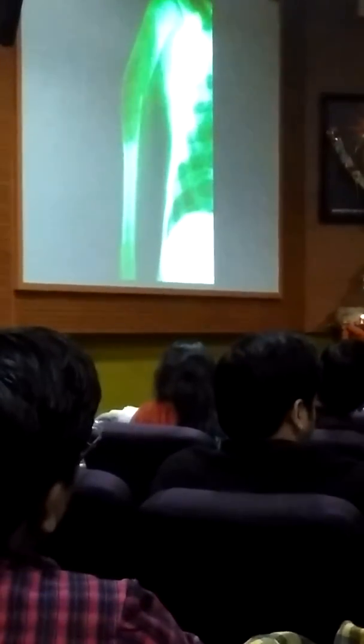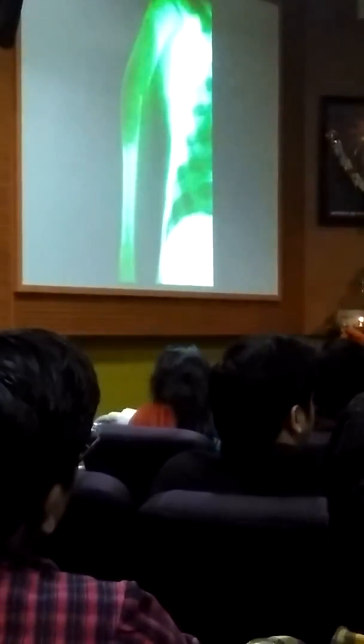Now all these x-rays which I am going to show you are from my personal collection. When a radiologist teaches you, he sometimes doesn't know the actual diagnosis. So I have treated them all and I can certify in the end that this is the diagnosis which proved to be. So this was a boy, 7 to 8 years old. The mother just pulled the arm and he felt some clicking sensation, without a fall. So this is a pathological fracture.